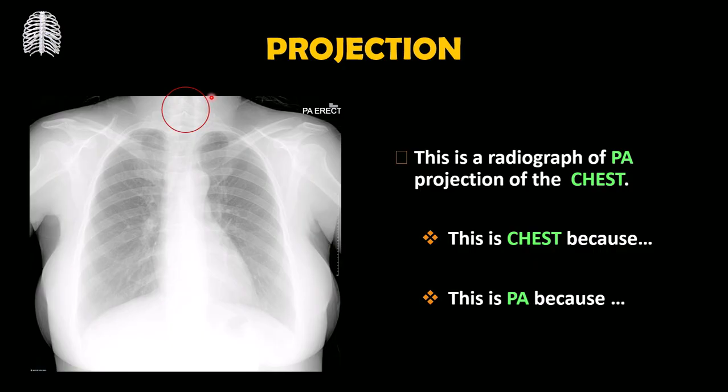In this radiograph, the vertebral bodies of C6, C7 and T1 appear distorted, the intervertebral disc spaces are closed, and the spinous process and laminae are well visualized. Besides, we can see that in this radiograph, the spinous processes of C7 and T1 are seen at the superior aspect of their vertebral bodies.